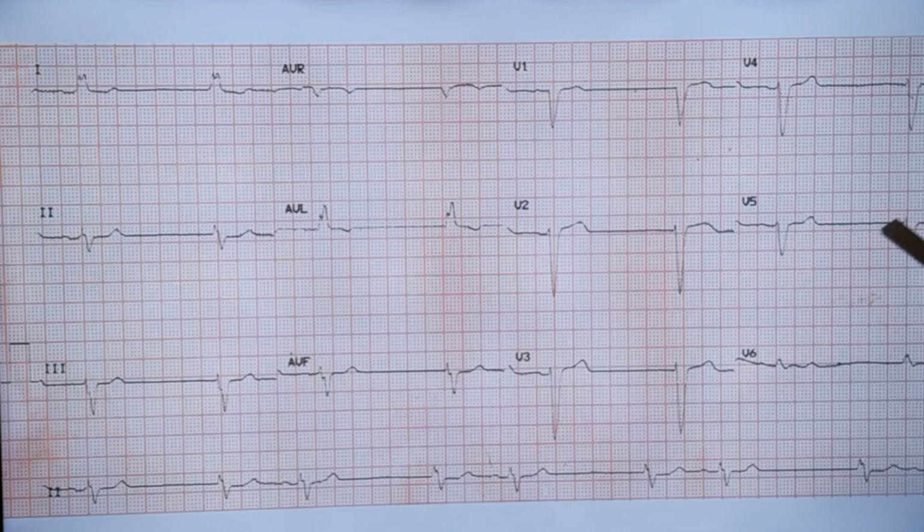So it could be a progressive disease, that is, in pan-conduction disease, you can have bundle branch block initially and then the AV node can be involved, then the sinus node can also be involved, binodal disease. So this person is likely to have Stokes-Adams attacks because it's an infrahisian disease combined with suprahisian disease. So you have to evaluate fully for any reversible causes, and if there are no reversible causes and the person is symptomatic, then this person might need a permanent pacemaker, which will be decided by further investigation only.